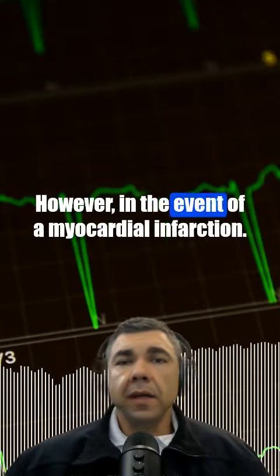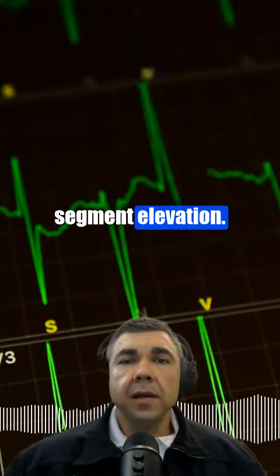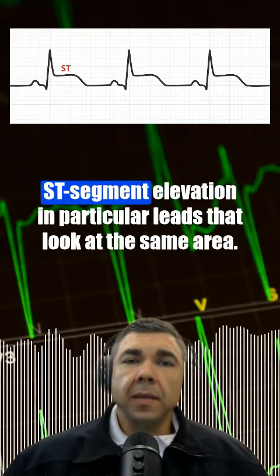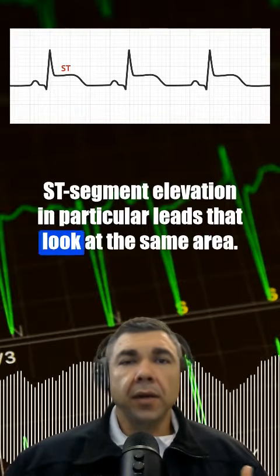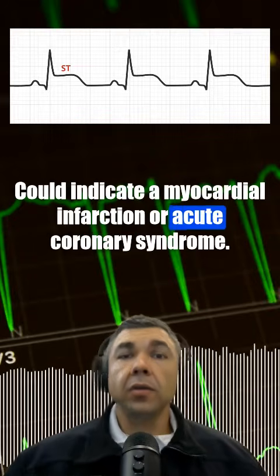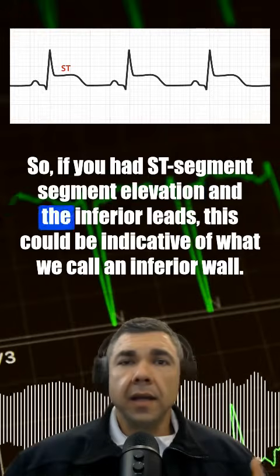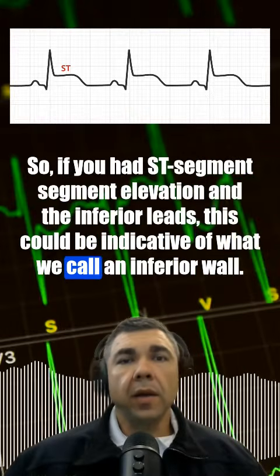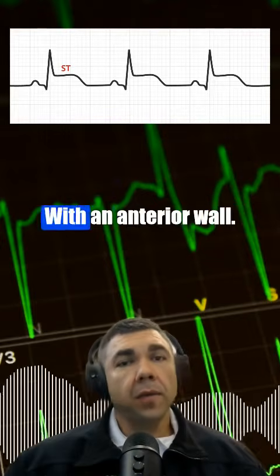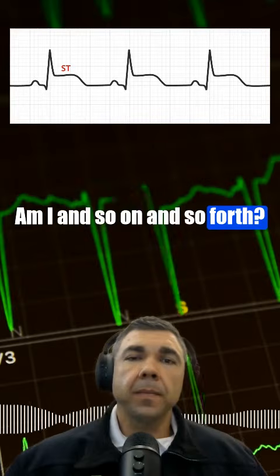However, in the event of a myocardial infarction, you may get something called ST segment elevation because of the leakiness of the damaged cells. ST segment elevation in particular leads that look at the same area could indicate a myocardial infarction or acute coronary syndrome. So if you had ST segment elevation in the inferior leads, this could be indicative of what we call an inferior wall MI. You could have this in the anterior leads with an anterior wall MI, the lateral leads with a lateral wall MI, and so on and so forth.